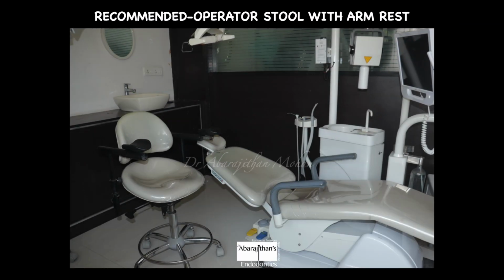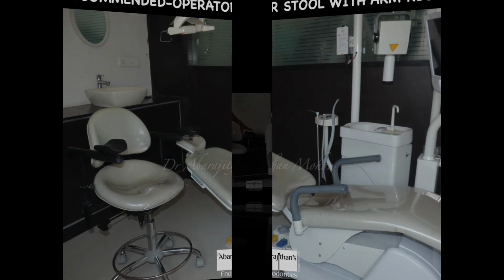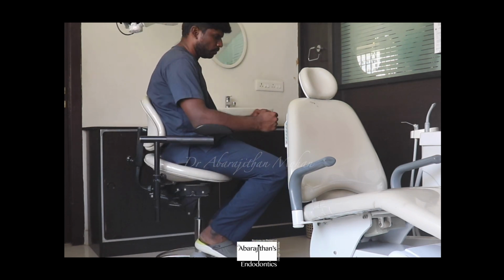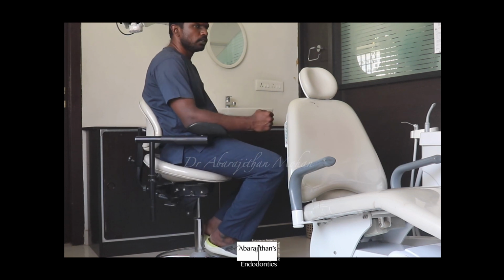So what is ideal as a dental stool is, we need to have an operator stool with armrest, and preferably armrest on both sides. The advantage of this is it gives me a very good neutral position where the arm is rested, which gives rest to the shoulder as well, and my movements are now going to be restricted only to the wrist and the fingers, that is class 1 and class 2.